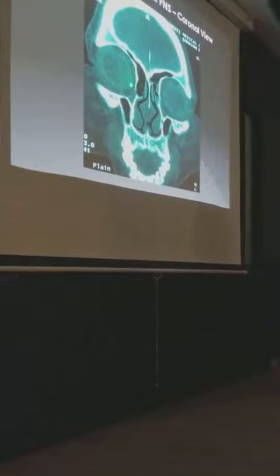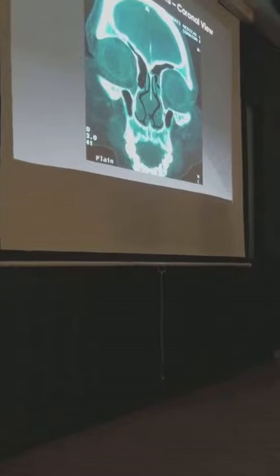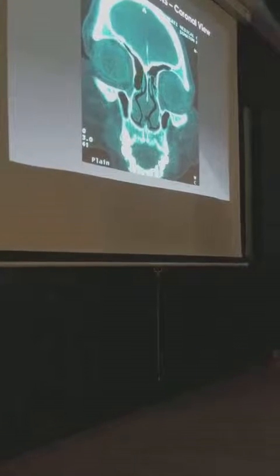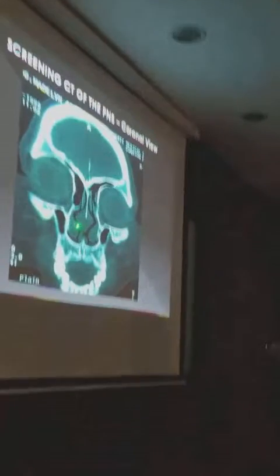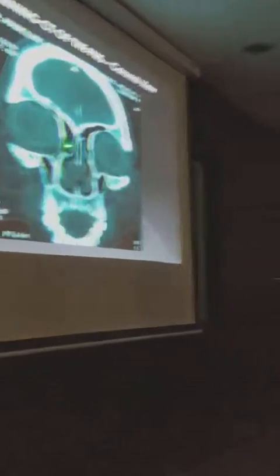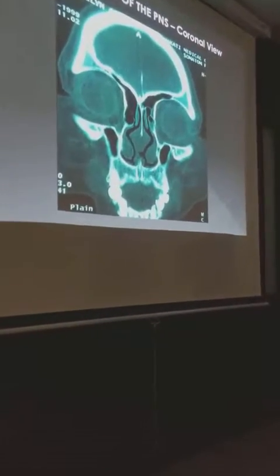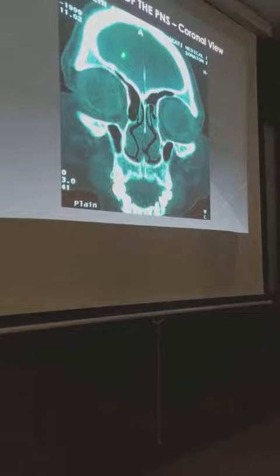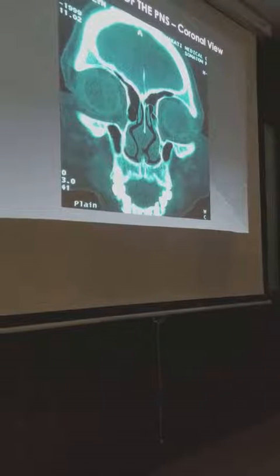So you see here a pneumatized cell in the lateral wall. Agree? Okay. You see the beginnings of your what turbinate? Middle, because that is the inferior. Now you can see a pneumatized cell here on the lateral wall. So the rule is, the first pneumatized cell that you see on the lateral nasal wall, before you see the middle turbinate in its entirety, is what cell?